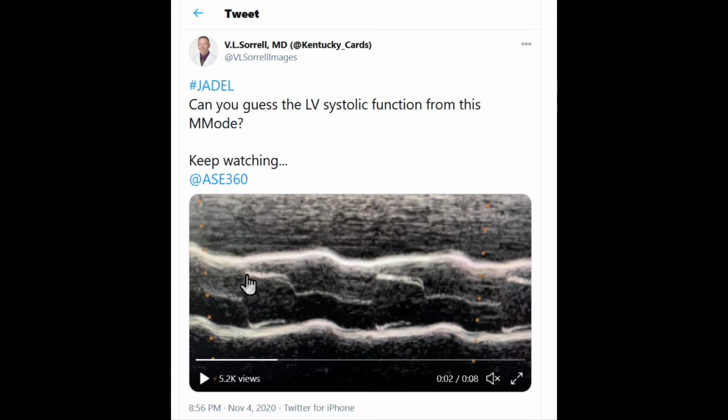You can measure this distance from the initial full opening of the aortic valve to the end of the aortic valve. If you were to measure this distance, it would be shorter than this distance. Maybe it's easier to see on this leaflet right here, where the slope doesn't maintain its full opening, but it's actually dragging closed, and here as well. So this distance here is smaller than this distance. And that only happens when you have an incredibly low stroke volume.